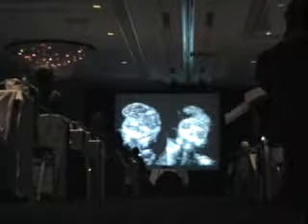Early on, though, sometimes, and this is at about 12 weeks, you can see that the brain has formed in part in this fetus that did not have a skull. You can see the orbits right here with the lenses of the eye. But you can see that there's some brain that has formed, and this may go under the name of acrania. It's basically the same thing, acrania and anencephaly. It ends up with the same prognosis.